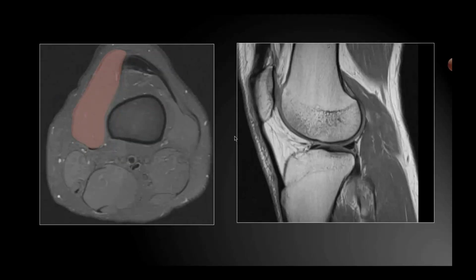Okay, so identify the muscle that is shaded in red, muscle or tendon, I should say. Give you a few seconds to do that. Okay, next.